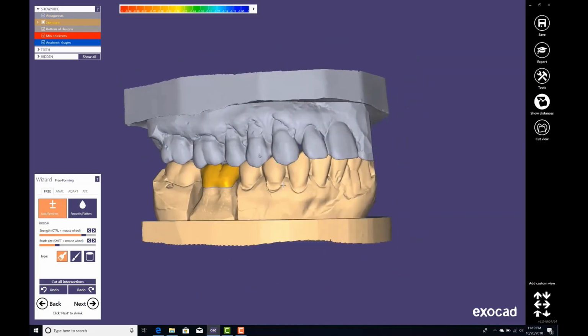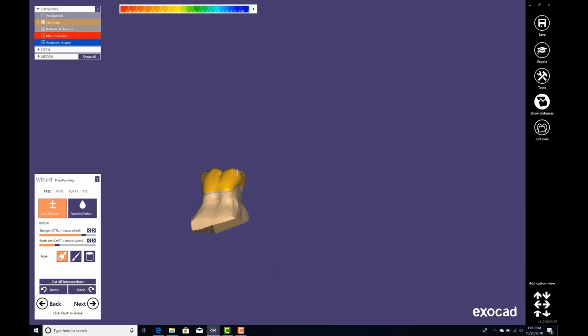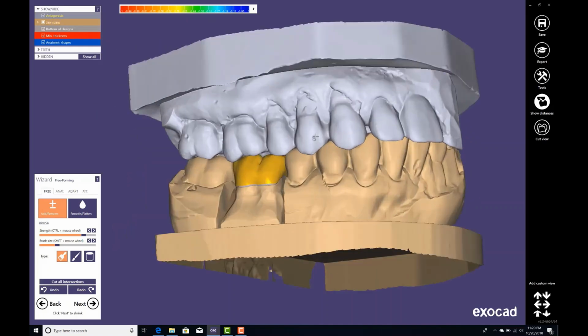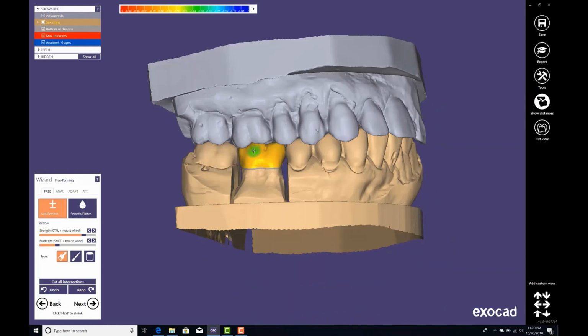I'm going to give you another example. Let's say I want to take off upper, lower and crown. So Control wheel on upper, Control wheel on lower, Control wheel on the crown. As you can see, I took off three of them. Now if I want to bring them back, I click Control Shift and the wheel, 1, 2, 3, and they come back in sequence. It's a pretty cool hotkey. It makes your life much easier when you start to work on really big cases.